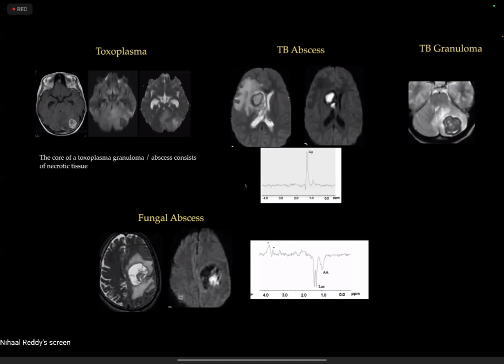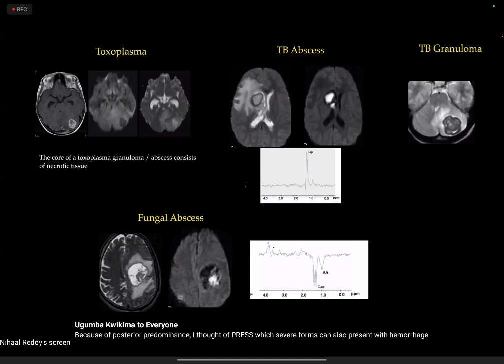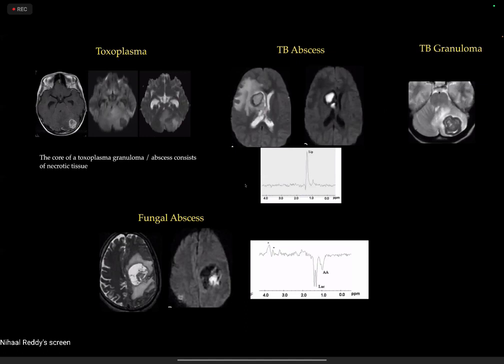Very peculiar location for hematomas, only affecting the posterior aspects. I think it's very unlikely to be a resolving hematoma. Yeah. Fungal infection, fungal abscess has to be ruled out. I think contrast needs to be done. Yeah. Because the veins are not. Apart from the imaging, what is the other suspicion for fungus here?